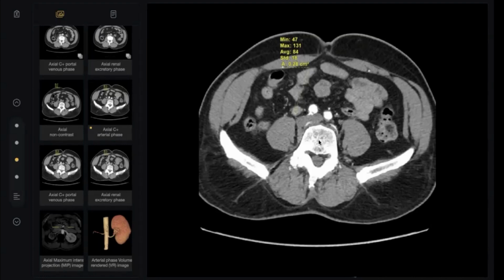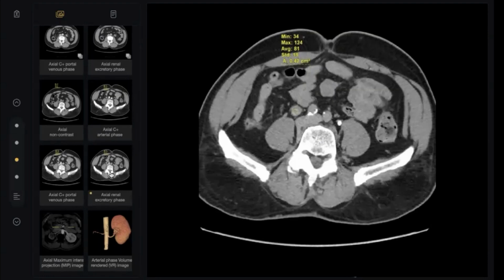This is probably the right ureter. I think it's due to prolonged obstruction. It may lead, I think, to chronic obstruction that leads to severe loss of renal cortex on the right side. Excellent, excellent. Really, really excellent. Look, what happened here?